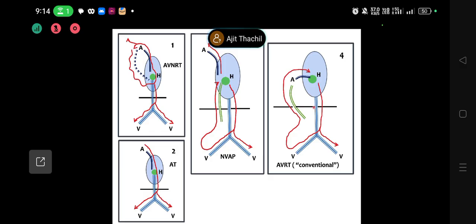But for this circuit, let us say the ventricular activation is reached here, and at that point, a PVC originates from here. Either we put the PVC or a PVC originates spontaneously. What happens? The next atrial activation will become early. That will not happen here. So an atrial activation becoming early after the His bundle is activated, meaning when the antegrade part of the circuit is refractory. After the His bundle is activated means antegrade part of the circuit is refractory.